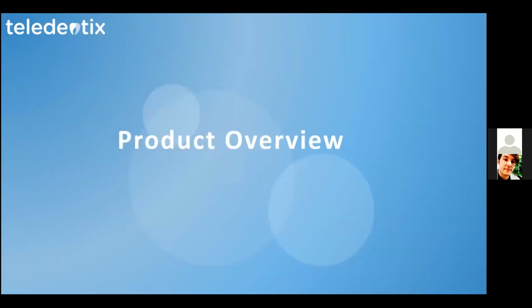All right, awesome. So let's go ahead and take a look at the product overview first. I'm going to go ahead and share my screen here and log into my Teledentix account so you guys can see what that looks like.